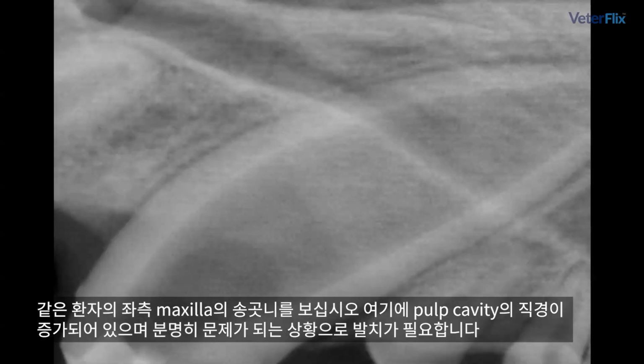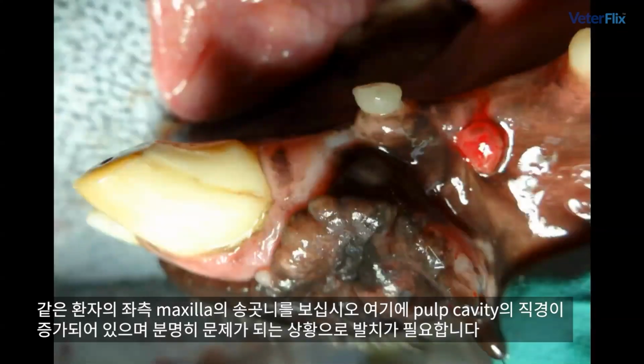We look at the maxillary canine on the left side, the same patient. We've got an even larger pulp cavity diameter here, and certainly a problem in this patient as far as extractions go.